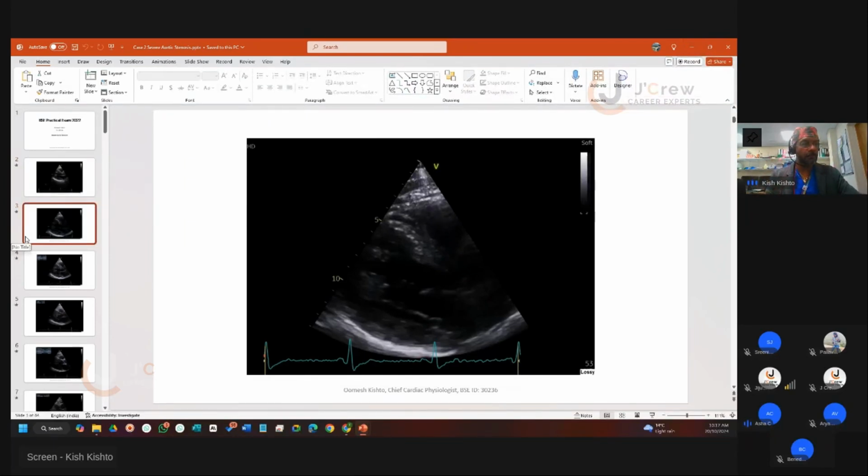Sir, I have a doubt. In normal rhythm it is fine, but in AF patients and irregular rhythm patients, I always have a doubt. After putting a CW to assess it, some waveforms in the Doppler will be small and some waveforms will be elongated. I don't know which waveform to select to get the trace for max and mean for AS, and for AR also, how to get the PHT, what waveform I should select. I always have a doubt, the elongated one or a short one.